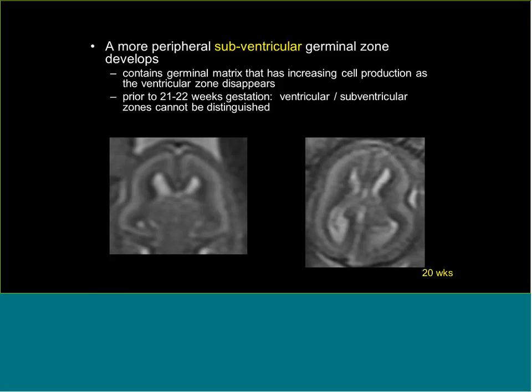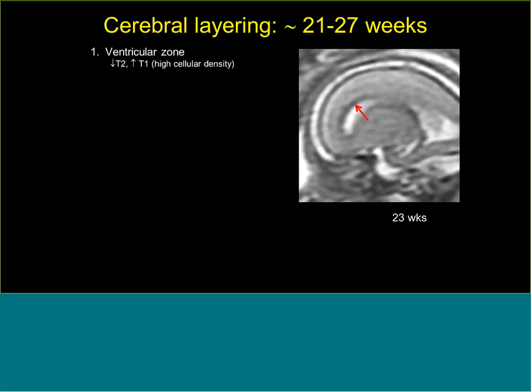Let me show you what it's like when you can see it for sure. We talked about this being the Oreo sign. Oreos? I never heard of that. So Oreo cookies. Well, I heard of Oreo cookies.